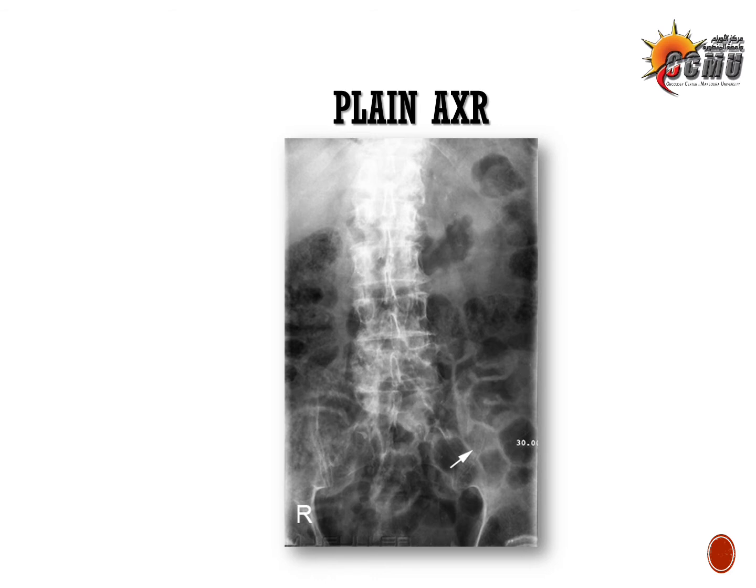There are shadows of gas in the center of this film, and with the white arrow, the small bowel is outlined by this gaseous shadow, but it does not show dilated small bowel, as the dilatation is not beyond 3 centimeters. So this is a normal gas pattern inside the small intestine.